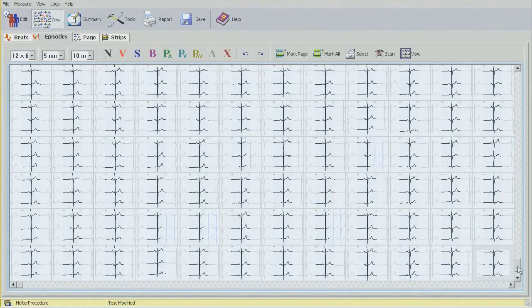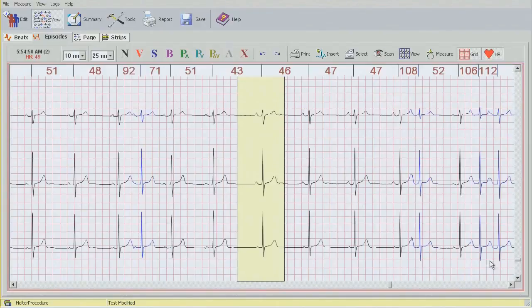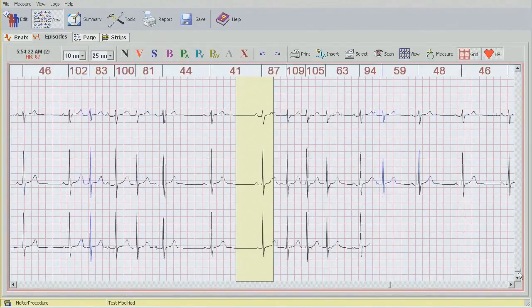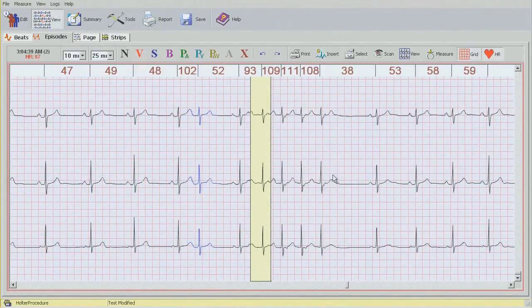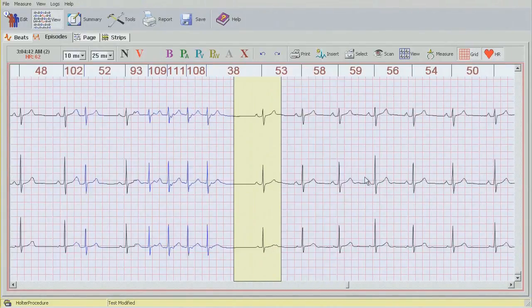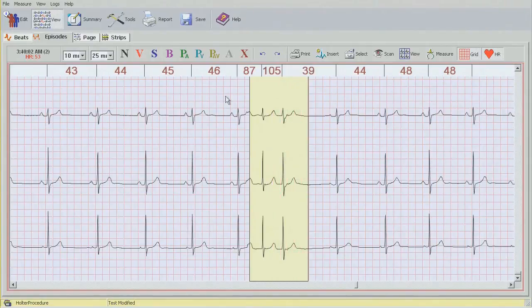And again, I'm just going to double click on the last character and bring it all the way down just to see the longest one. And we have another one. I'm going to label. Now I'm going to work backwards, so just click up and go back until I do find the longest NN.